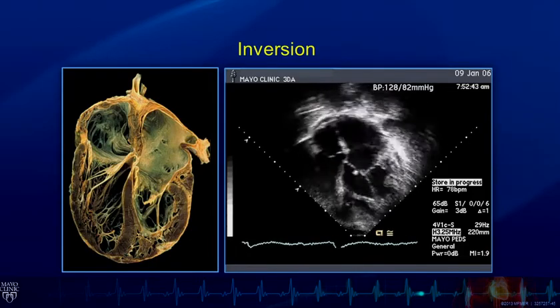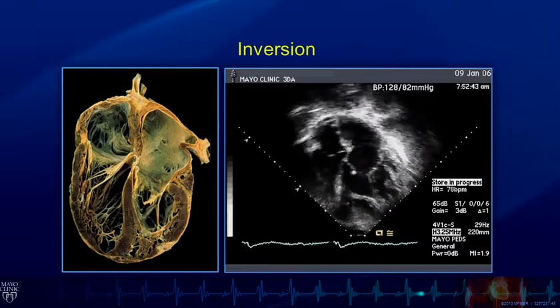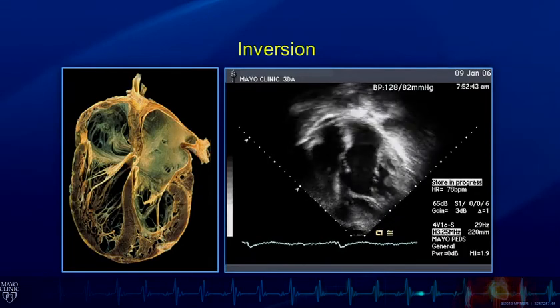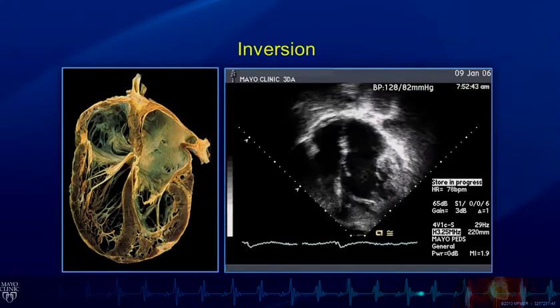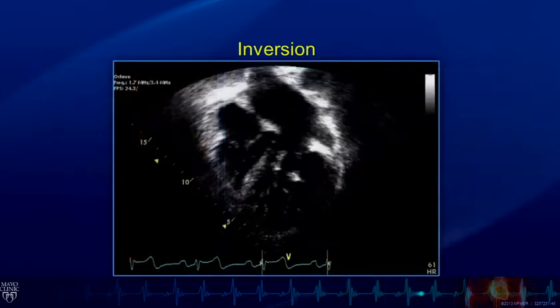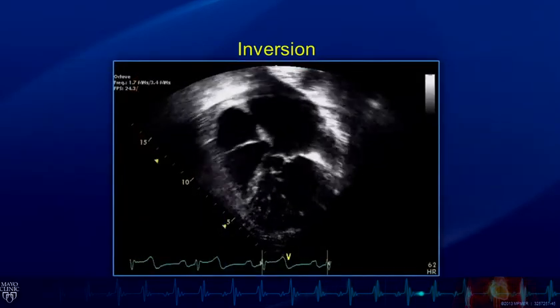The problems that arise in these patients you'll hear more about later, but not surprisingly, the morphologic right ventricle doesn't stand up to the systemic circulation, neither does the tricuspid valve, so we see ventricular dysfunction and atrioventricular valve regurgitation. So, systemic atrioventricular valve regurgitation.